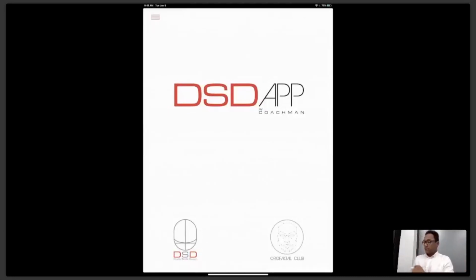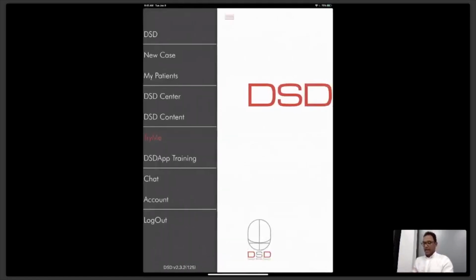All right, guys. So on your top left, you'll be able to see the menu bar. So you tap on that menu bar. And today, as I'm saying that we will do an introduction of a 3D smile design, I want you to also practice. Hi, Maribel.